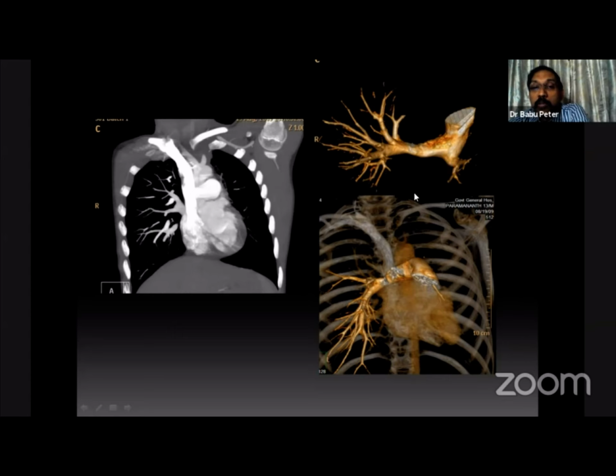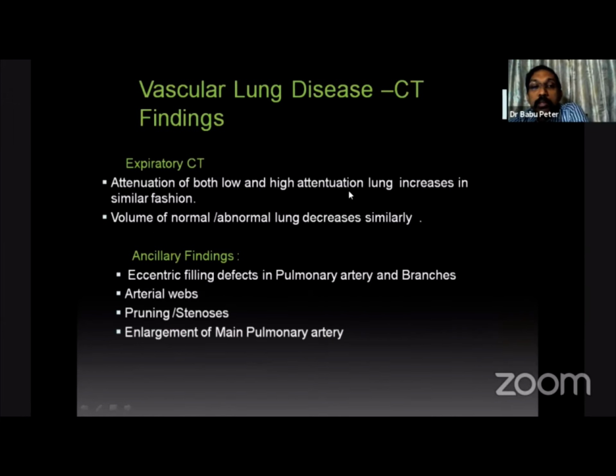So what is this abnormality, or what will you suspect in this patient, a child who presents with recurrent respiratory infections? So the diagnosis would be a case of Swyer-James syndrome or McLeod syndrome. So this is basically again a bronchiolitis which is presenting with recurrent URIs in children, and you can see diffuse low attenuation of the lung with pulmonary hypoplasia in these patients.